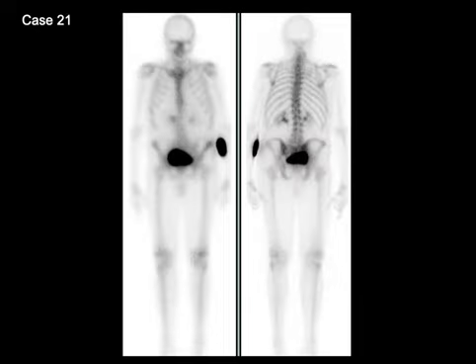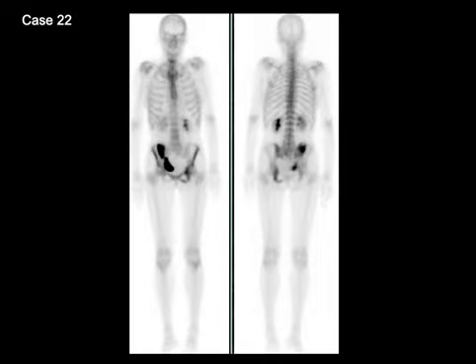Case number 21 shows an interesting artifact. This patient was claustrophobic, and as they were lying on the table and the anterior camera head was in front of them, they wouldn't tolerate it very close to their body. So the technologist had to move the camera head away from them, because of which the resolution of the anterior image decreased, and you can see that this is a sort of a suboptimal image. But the posterior camera head, which is behind their table or posterior to the table, was tolerated very close to their body, and the posterior image shows normal resolution.